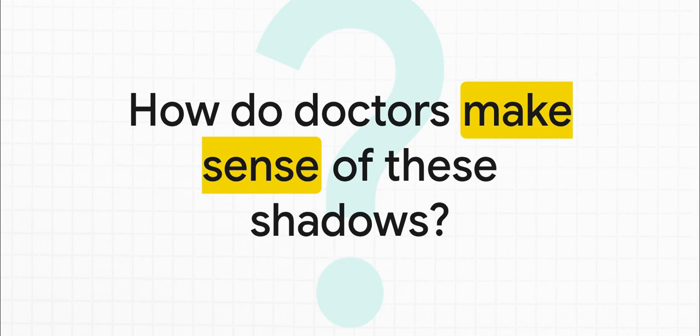Well, here's the secret. It's not magic, it's a method. It's a systematic approach that turns this seemingly chaotic image into a really clear set of clues. And that is exactly what we're going to break down.